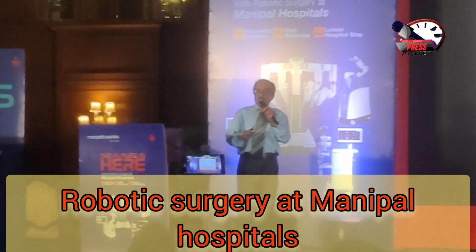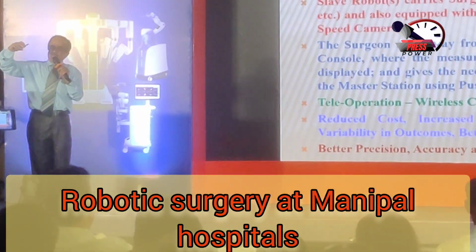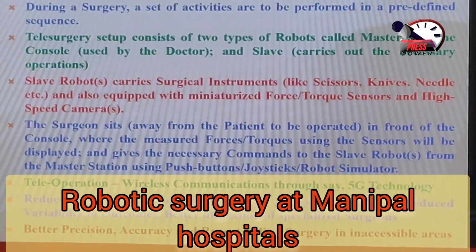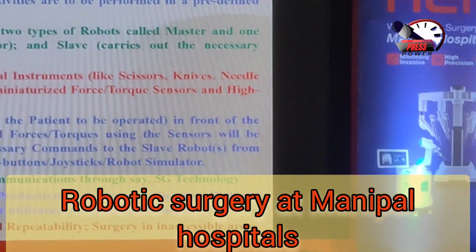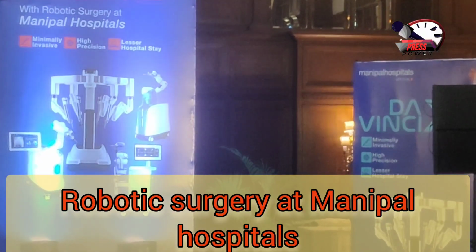Before the slave robot carries out that operation, the tip of the slave robot will have to reach that particular point. This is one problem. Might be the tip of this manipulator will have to follow or trace some straight line, or will have to follow some curved line.